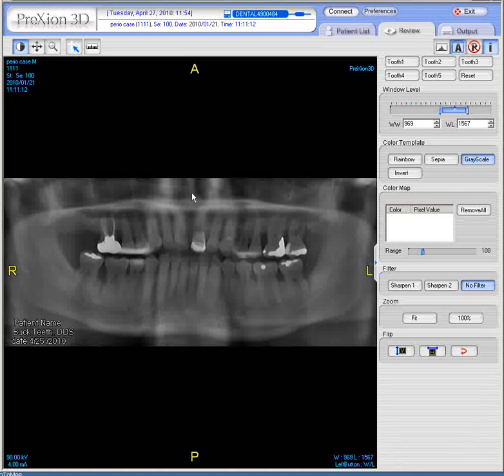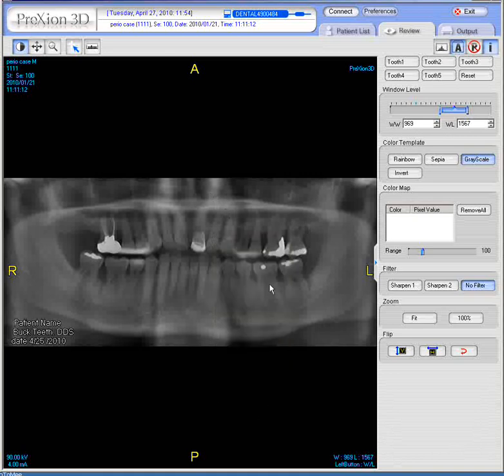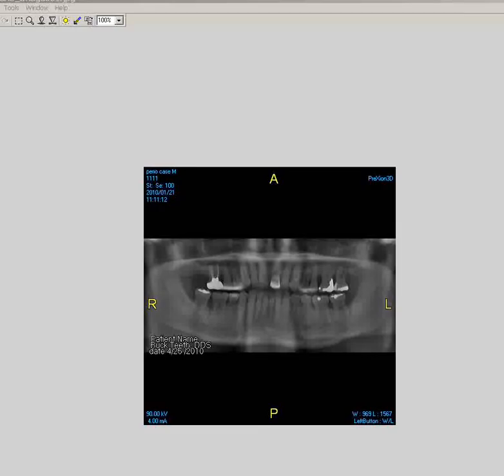Again, that last frame got out of sequence a little bit. Again, this is how they would basically use this panel image and right-click it, go to Save Image, and then they can do the necessary cropping. And there's many different ways, different programs out in the field that one can use to crop. You can use Microsoft or Microsoft Photoshop Editor, Snagit. There's other programs. Here's one. It's a free program that I use.